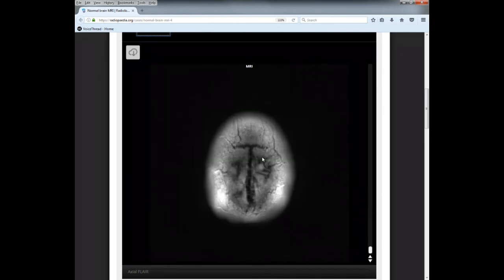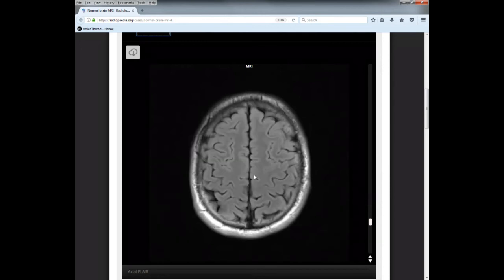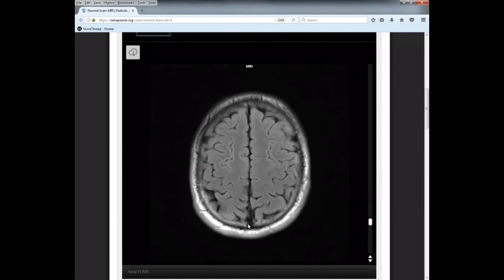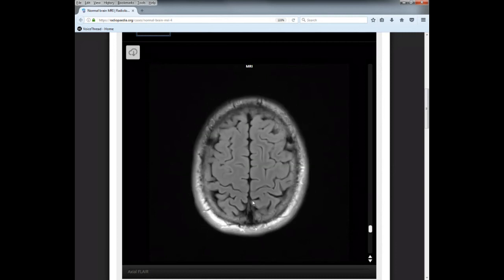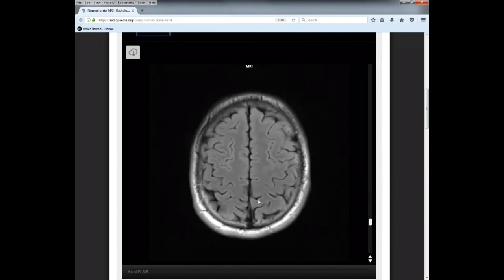All right, so again, rewind. Back to looking for the difference, what separates the frontal lobe from the parietal lobe. So we want to travel down, and you want to look down here, and what we're looking for is the cingulate sulcus, okay? The cingulate. How do I find that? Who knows, right? You want to look for a mustache. You want to look back here in the posterior aspect of the brain, just lateral, just coming off of the longitudinal fissure, and you're going to see this kind of mustache here, okay? Here's your mustache.